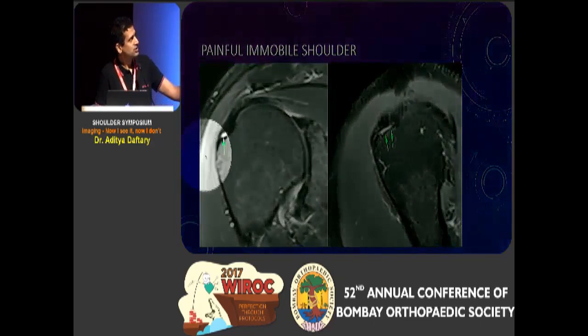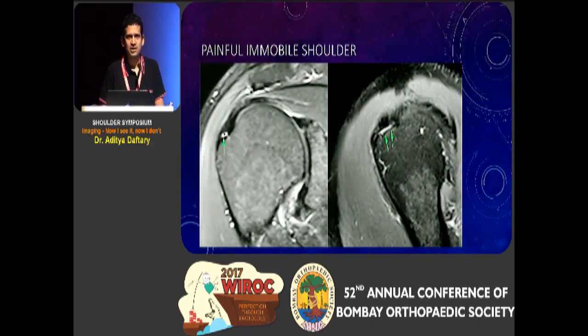Some small, subtle bursal-sided or pasta and antipasta lesions, as Dr. Narvikar likes to call them, are things that can produce pretty intense painful symptoms and can be missed quite easily on a poorly done MR. So I think it's important to look for those.